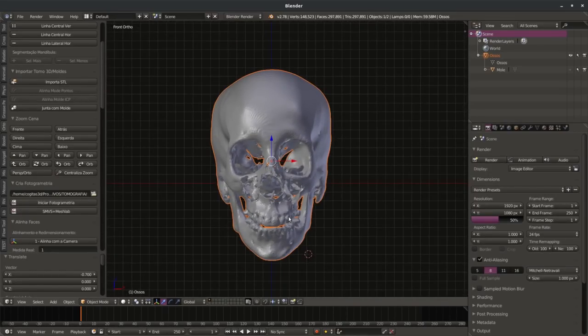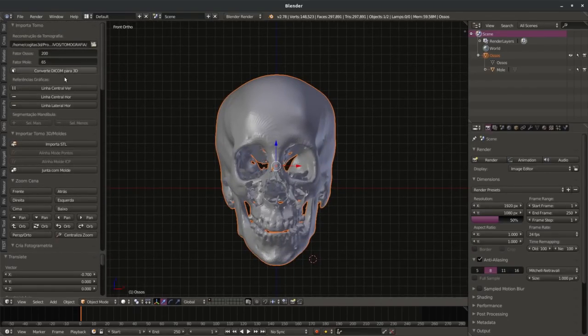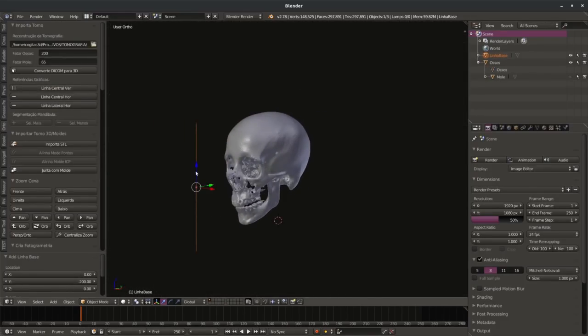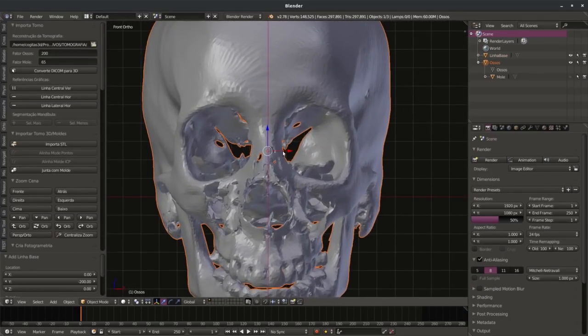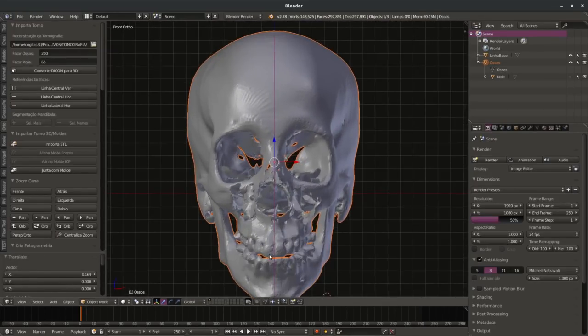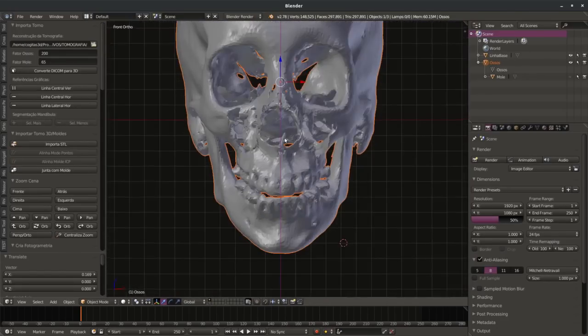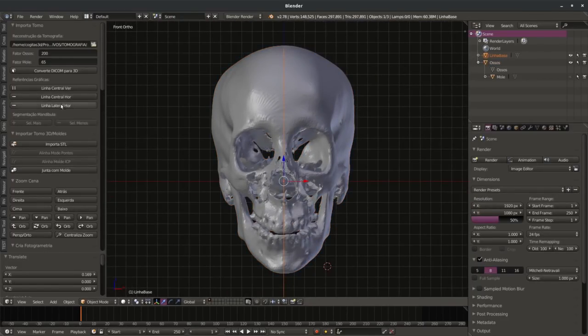After you move the bone here, we can see the other buttons. For example, we have some buttons of lines. This is a central vertical line. I will click here and will create a line, and you can use this line like a reference to move the bone and put it in a place that you can see the middle of the bone, the structure, and the line will be your reference.